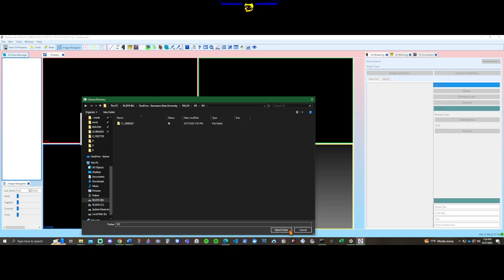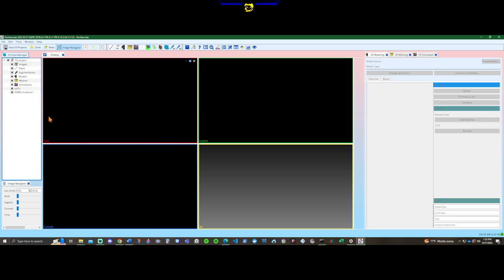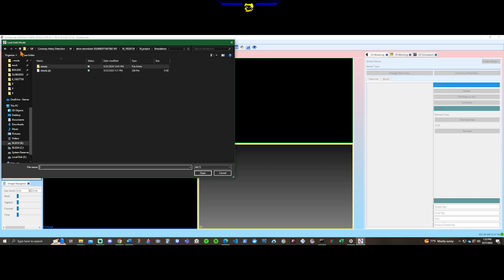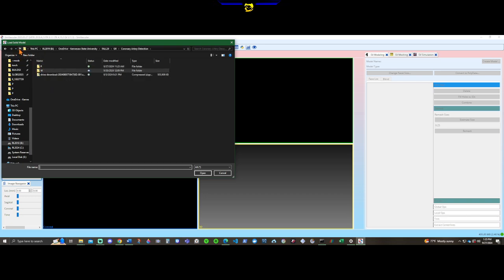I'm going to create a new folder, and we'll call it SV project. And now I think it will be fine to have multiple models, multiple meshes, and multiple simulations under one. So we're going to first of all import the STL that we just created. The clipped.